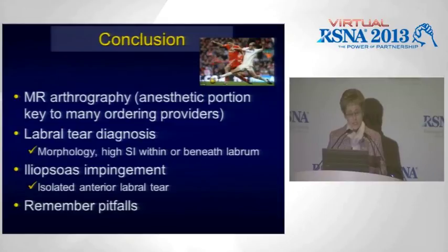When we diagnose labral tears, it's important to start out with the morphology. Is it triangular in shape? Is it blunted? And also look at the high signal. Does the high signal extend within the labrum or beneath the labrum, representing a detachment?